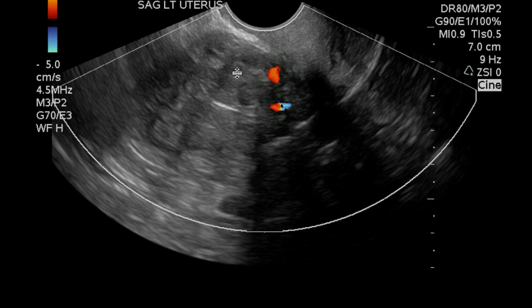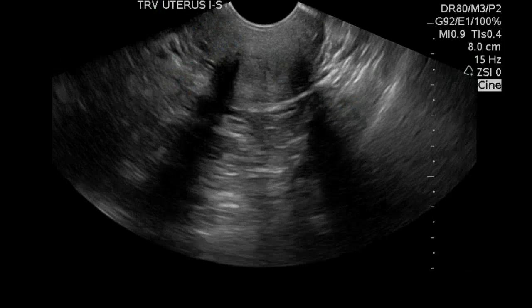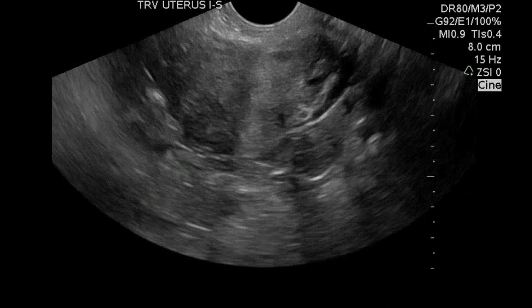We can scroll through cine clips and look at all this, but it's really helpful to document that either in a report or right on the scan itself. Again, is this mid-uterus, lower uterine segment, fundus? I have no idea, just looking at these pictures.